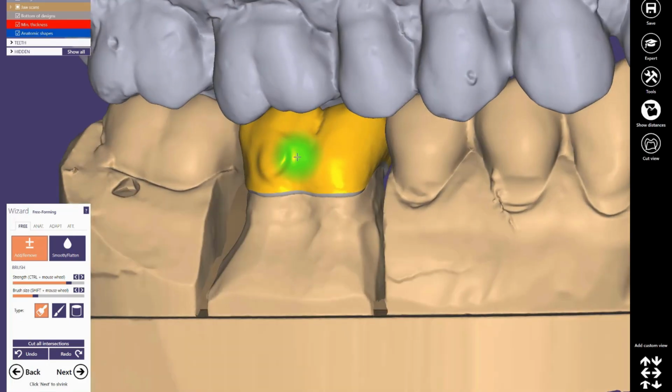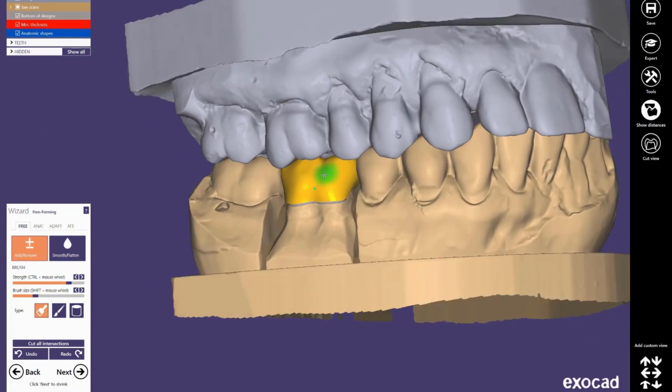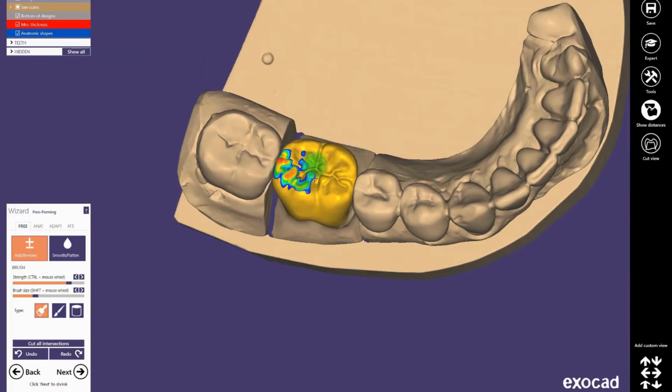But let's say that now I want to smooth, because I don't like this little bubble I have here. By clicking control and shift, my brush right now becomes purple. So control shift and left click, and right now I'm smoothing. It's a pretty good tool which I suggest you use, because it makes your design life much easier and faster. You can have a really good workflow.